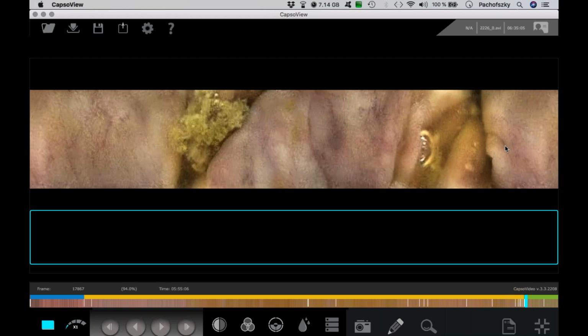And that's one of the difficulties at the beginning if you're looking at cases with the CapsoCam, because with all the other systems, these EndView systems, we know how to look from birth on, because that's the imaging we know. And here you have to look at what's going on.